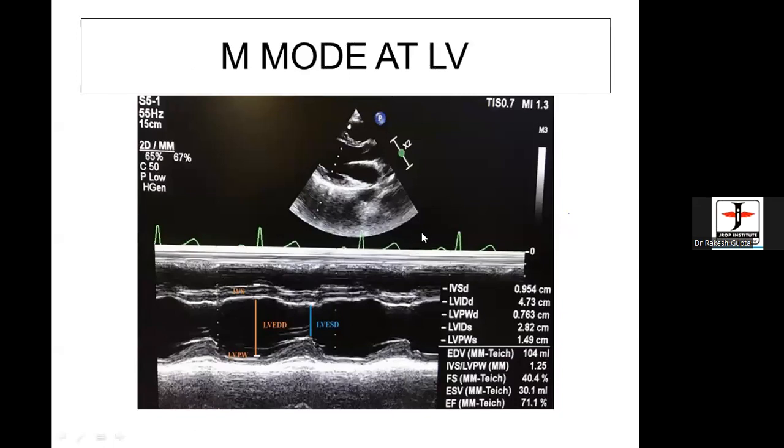Okay. So imaging quality, look at this image which Dr. Nandita is showing right now. If you have to measure septal thickness in two dimensions versus M mode, at the mitral valve level, it's better to measure in M mode rather than in two dimensions. Yes, yes.